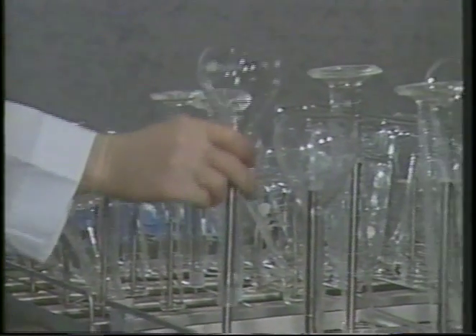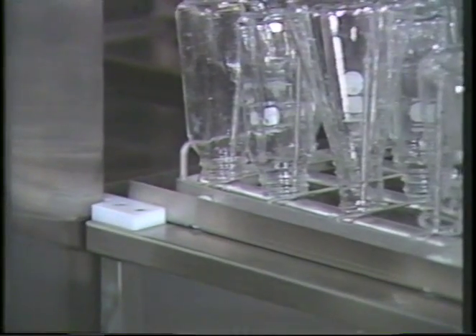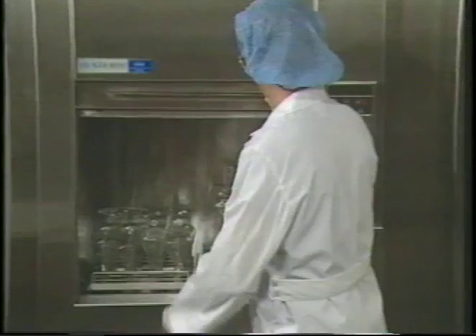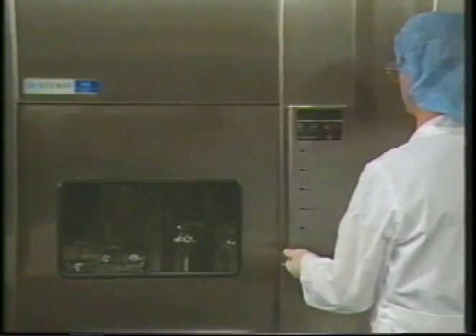Devices should be checked and placed in the chamber to assure free access of the spray arms. Adequate room between the load and the access door should be provided to allow for easy door closure, visual inspection of the load during the washing cycle, and comfortable removal.